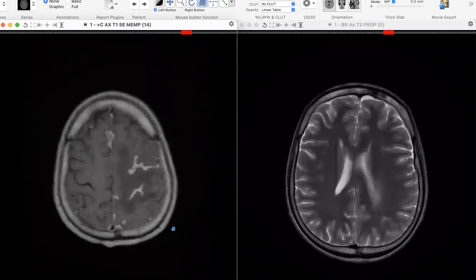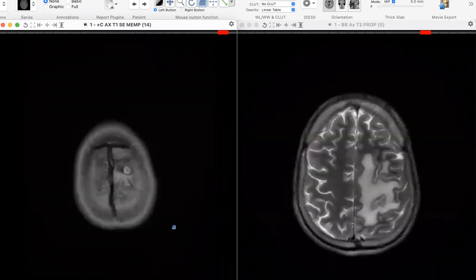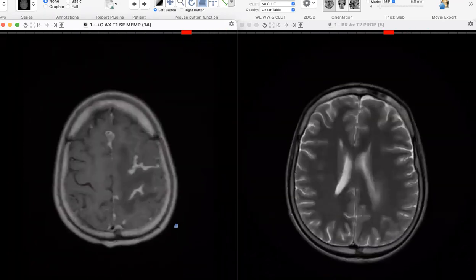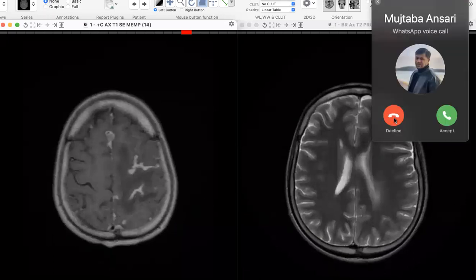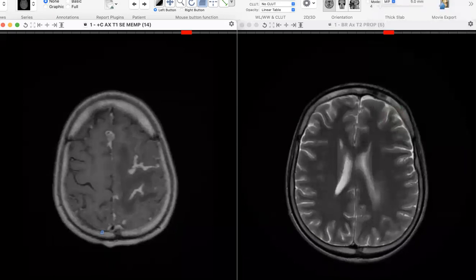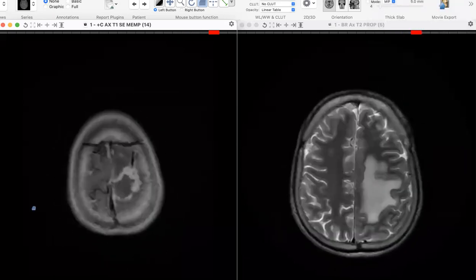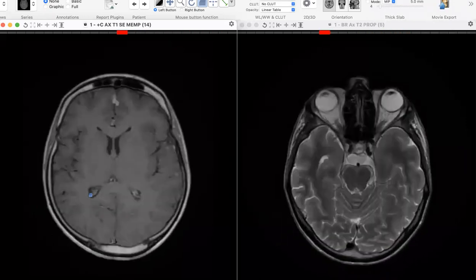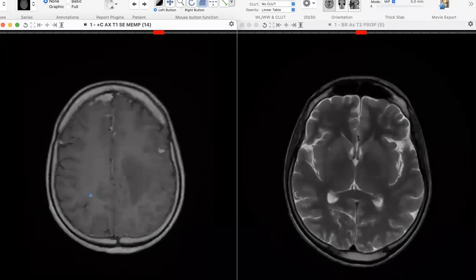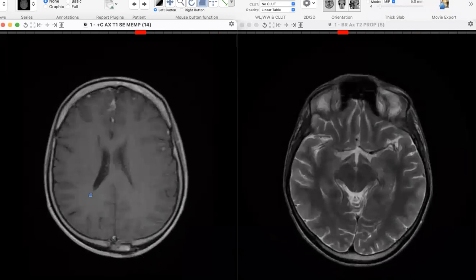No history of known primary. This patient is 30 years old. So I would correlate with inflammatory markers because I am suspecting TB versus sarcoidosis in a young patient. The inflammatory markers are elevated. What would your first differential be? My differential here would include TB versus sarcoidosis.